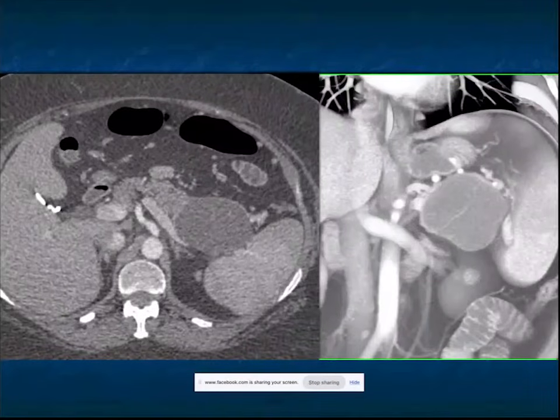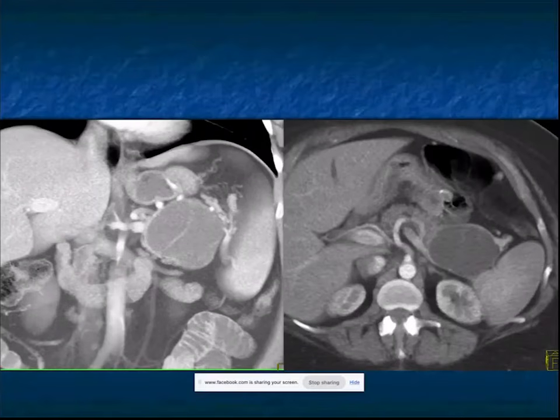Another case, back pain, complex cystic lesion by tail of pancreas. There are septations. It's not the good look for a neuroendocrine tumor or metastasis. It could be a serous cystadenoma with a thin septation. It could be a large IPMN. It could be a lymphoepithelial cyst, but those are usually more eccentric. It could be an MCN, a mucinous cystic neoplasm. It's a great location for it, and they do commonly have septations. Usually 40-ish-year-old female is the classic description.